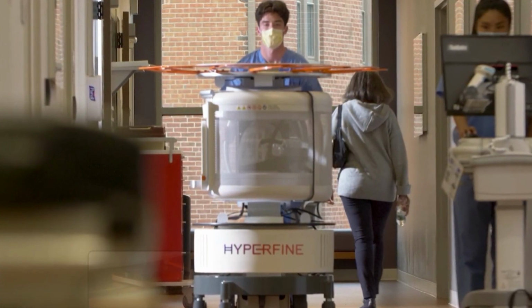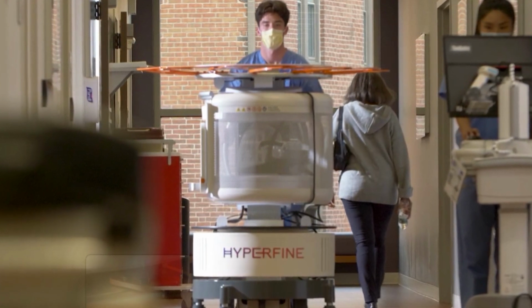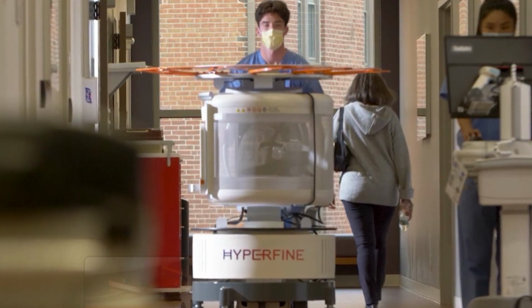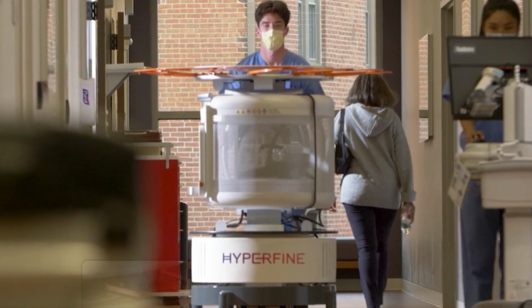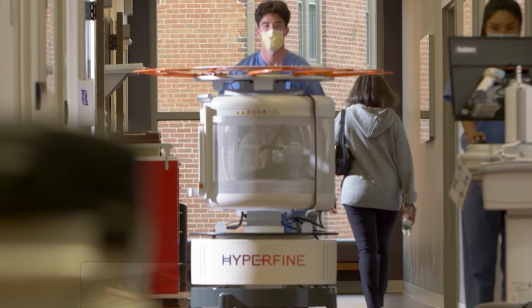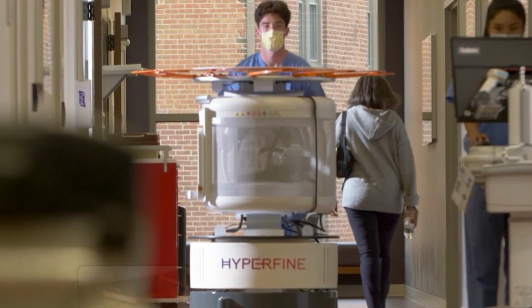As a result of this, of course, we're going to get some neuroimaging, starting with our Hyperfine Swoop MR producing a brain MR. The Hyperfine Swoop is always available on standby in the ED as a portable system and actually gets to John's room before he gets a chance to be wheeled to CT.